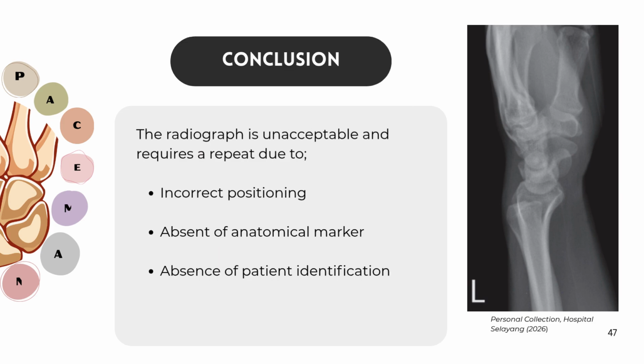For the conclusion, the radiograph is unacceptable and requires a repeat due to incorrect positioning, absence of anatomical marker, and absence of patient identification. This is all my presentation.